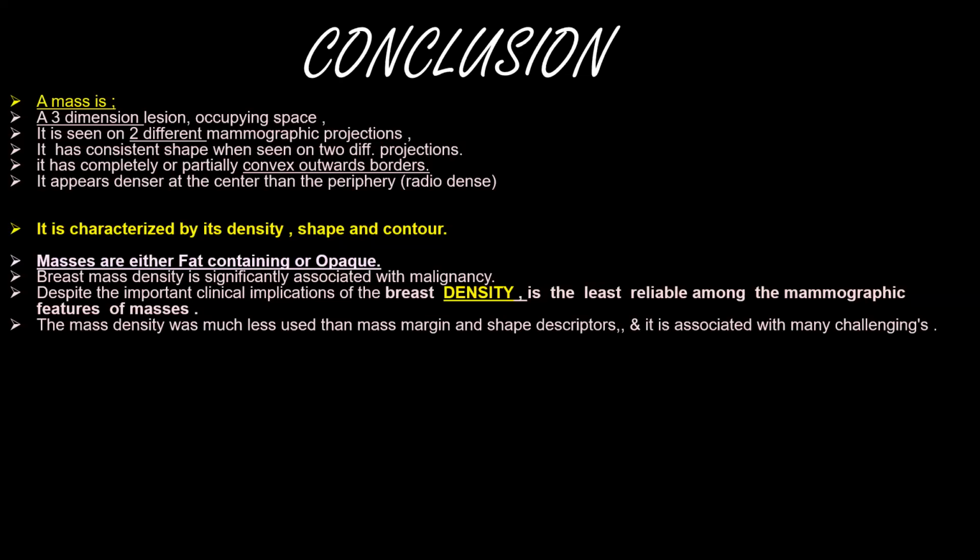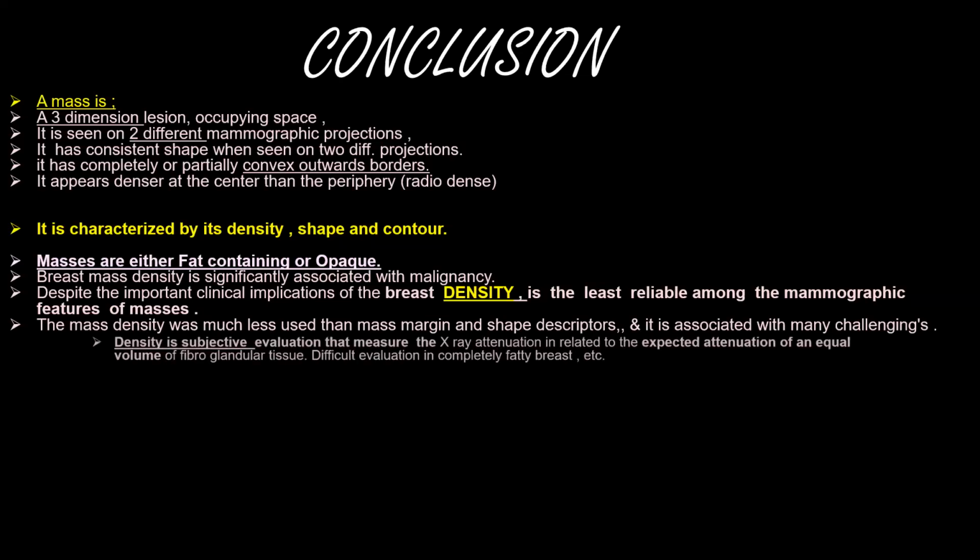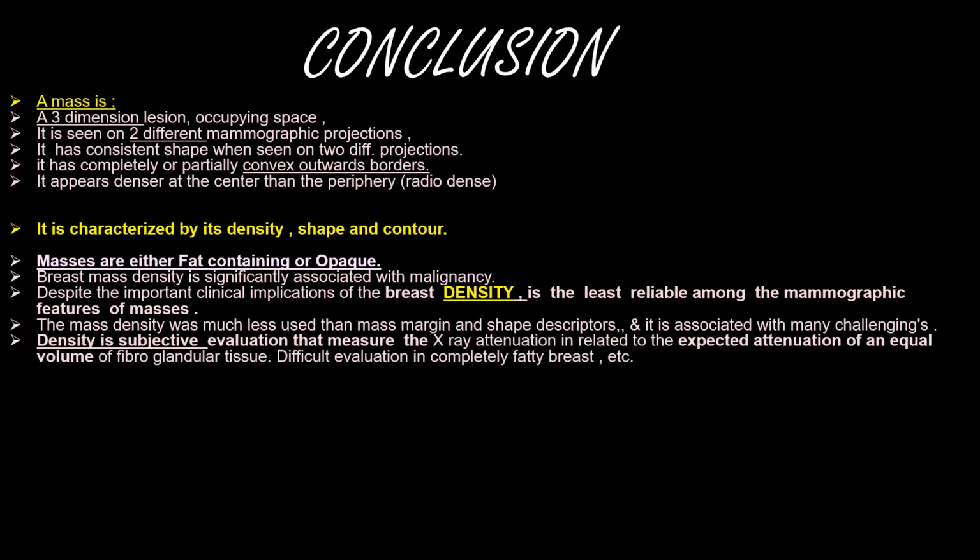The mass density is less used than the morphologic descriptors, and it is associated with many challenges, as we mentioned. It is not computerized measurable on 2D because of overlapping tissue.